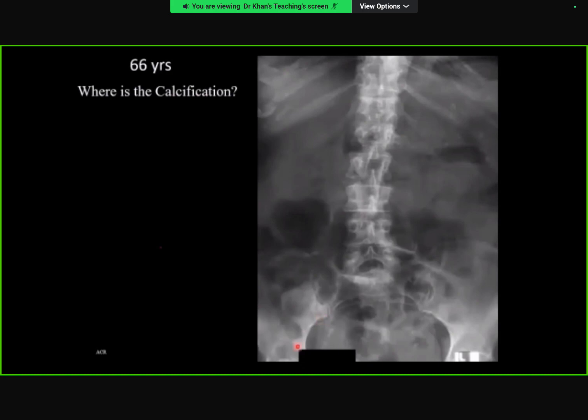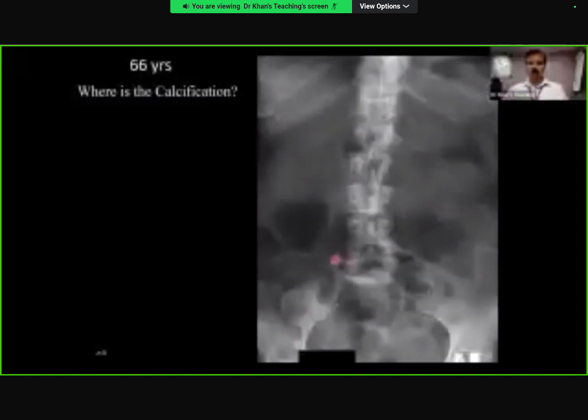Yeah. So in this region, what kind of vascular calcification? Actually, you will see it very commonly in old age patients. Splenic artery? Yes. So please remember that splenic artery is very tortuous, and it is classical like this, that where you will see this calcification as well as its tortuosity.